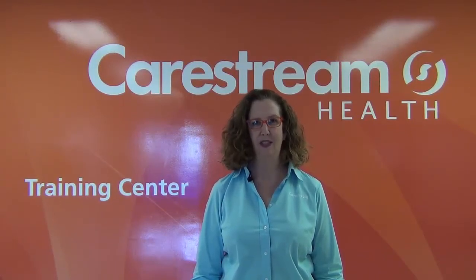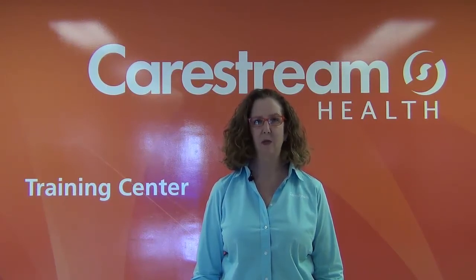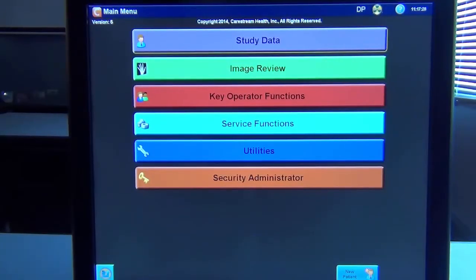I'm an applications consultant. One of the things that my team and I are responsible for is delivering customer training on the DIRECTVIEW software. This video is to demonstrate how to manually input patient information.